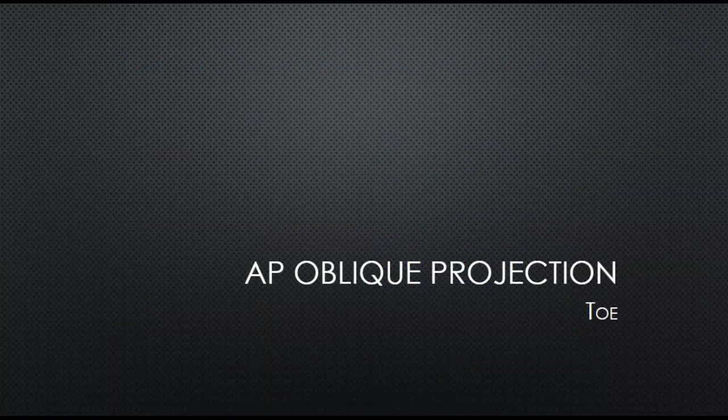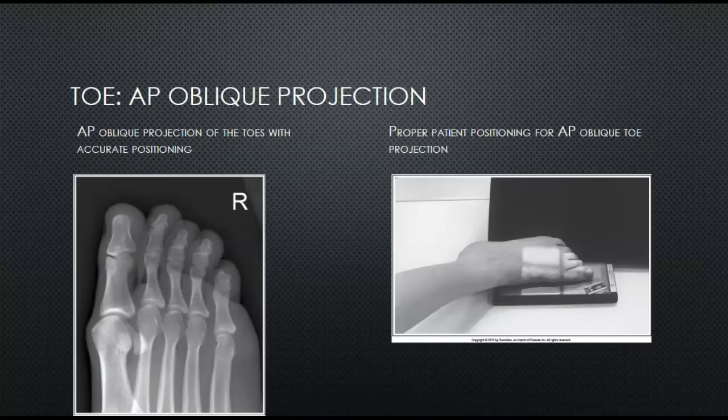Let's move on to our AP oblique projection of the toes. Image analysis guidelines for the AP oblique projection state that there should be twice as much soft tissue width and more phalangeal concavity present on the side of the digit rotated away from the IR. Interphalangeal and metatarsal phalangeal joint spaces should be demonstrated as open. The phalanges are to be demonstrated without foreshortening, with no soft tissue or bony overlap from adjacent digits.